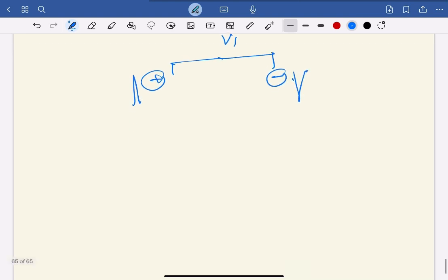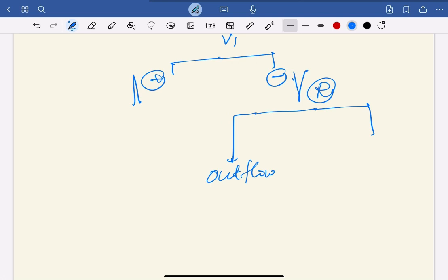If it is predominantly down, it is on the right side. When it is on the right side, there are three possibilities. It could be the right ventricular outflow, which is associated with right axis deviation. It could be the right ventricular inflow near the tricuspid area, then it is associated with normal axis, or it could be near the apex, which has left axis deviation.